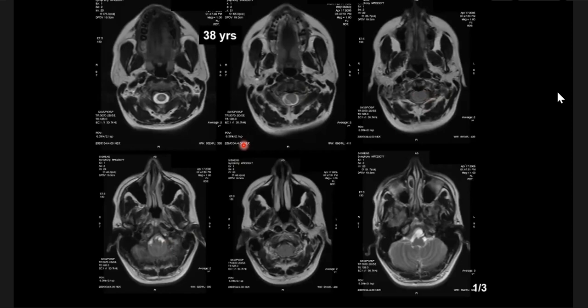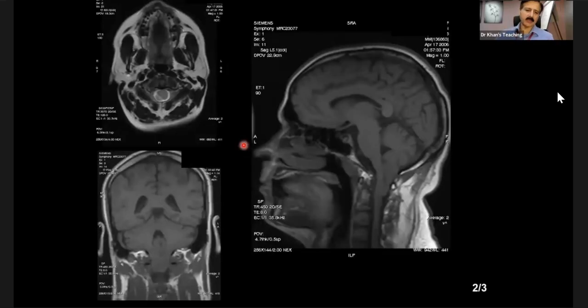Yes, please. I'm just wondering if there's increased intracranial pressure causing some herniation of the tonsils of the cerebellum. Okay, so the patient hasn't got that, but something else. You have got the diagnosis. Yeah, so it's a Chiari malformation. Excellent. So this is Chiari 1 malformation.